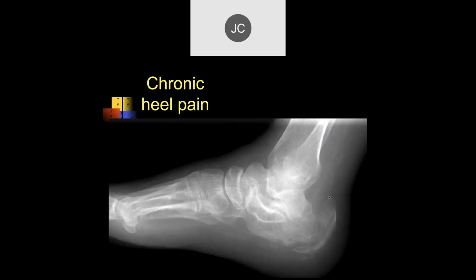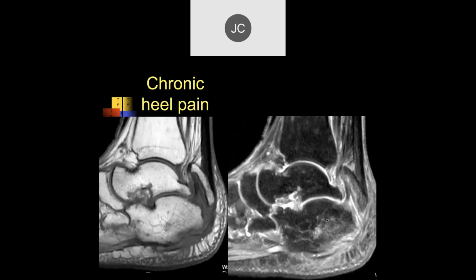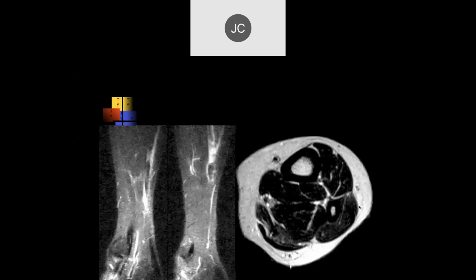And in older individuals, you can get chronic heel pain here also with chronic fractures that aren't allowed to heal involving the calcaneus. And here we can see a displaced fracture of the Achilles insertion on the calcaneus in this particular patient, calcaneal avulsion.